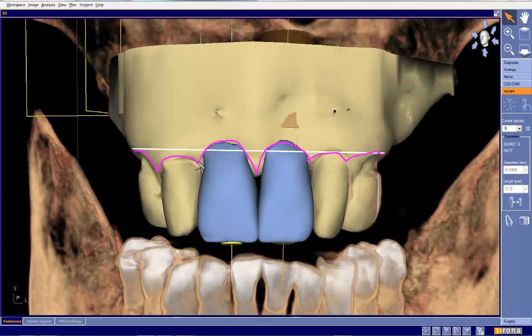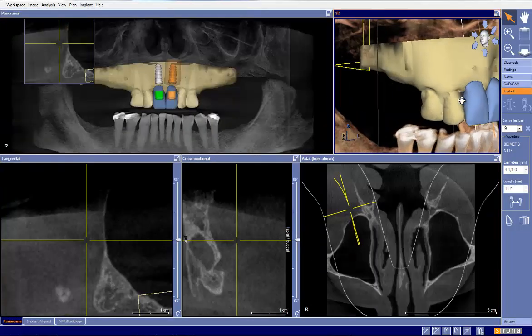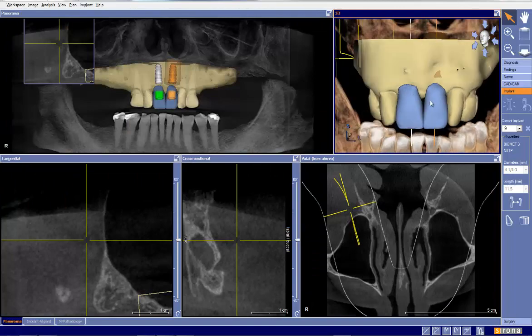So my assessment would be that we would actually want the gingival margin to be, let me just draw it here in green, we would want the gingival margin on these particular teeth to be more along that line like that, okay? And that will make a difference in terms of where we're planning. So let's make the assumption that the gingival margin is correct as drawn.